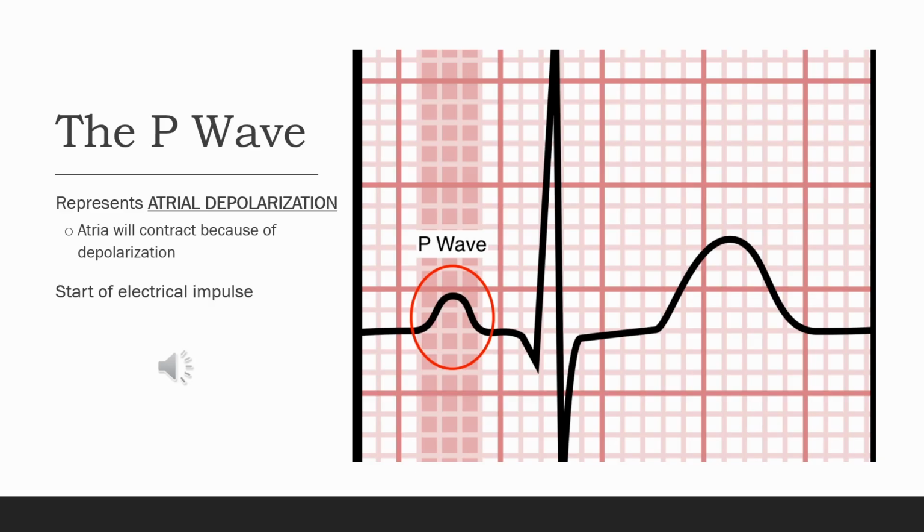This is the mechanical response to the atrial depolarization. So the appearance of the P wave can vary depending on the lead placement and where the electrical impulse originates. In a normal sinus rhythm, the P wave should be smooth, rounded, and consistent in shape across the ECG strip.